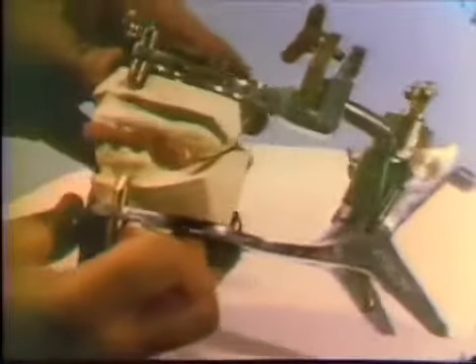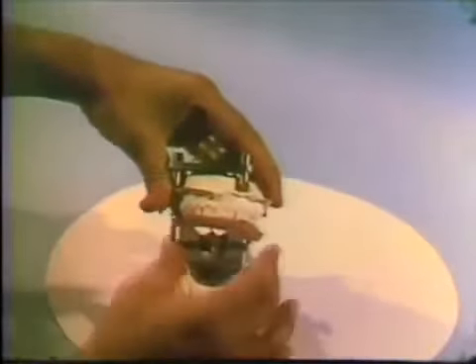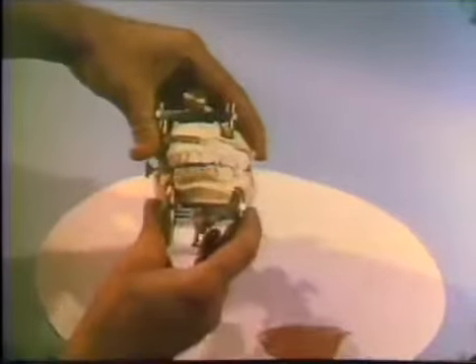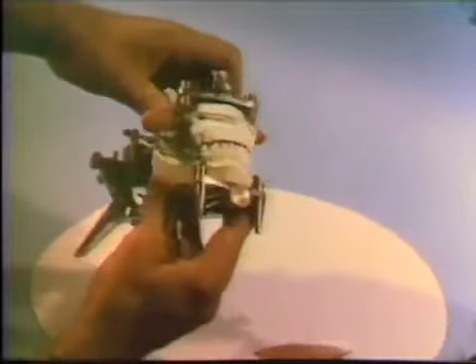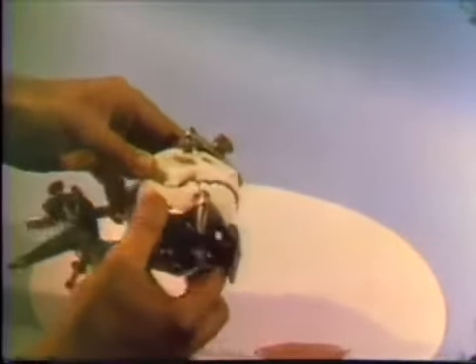Interocclusal relationships can best be evaluated when the study models are mounted on an articulator. A suitable articulator for this procedure is one that will allow a centric mounting with some freedom to develop eccentric excursions. A plasterless articulator of the Galletti type is very useful for mounting study casts.